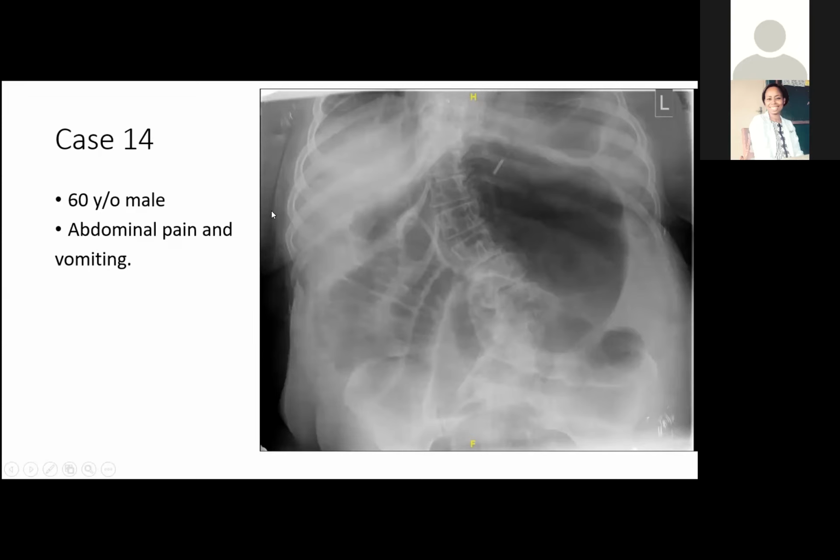So she has got dilated small bowel loops. There seems to be some outlining of the... it's tricky, this one. I think the patient has got small bowel obstruction. What exactly is causing it, I'm not very sure. Okay, so what investigation would you do next? Or what would you do next? Would you do any investigation? I would like to get a CT scan for this patient.